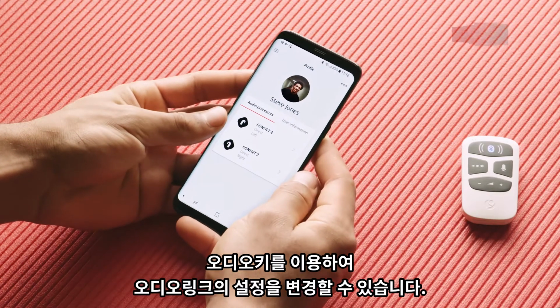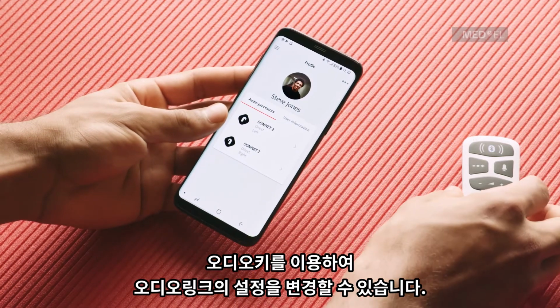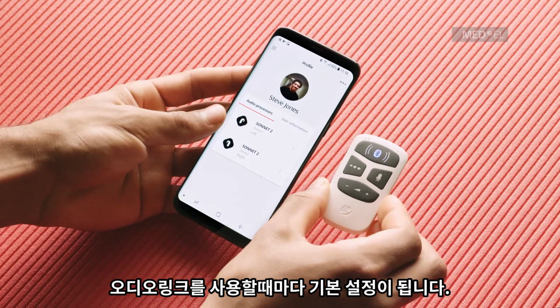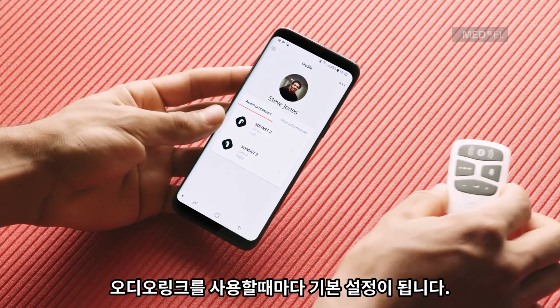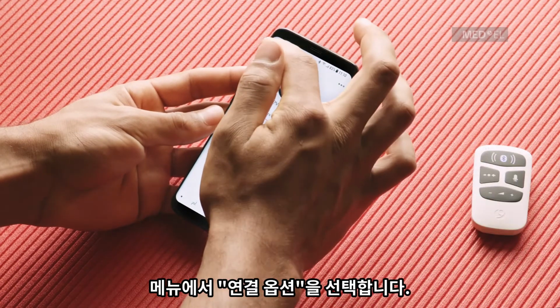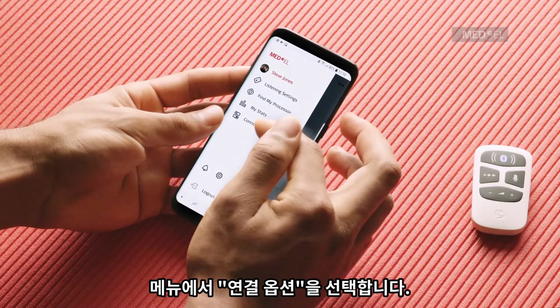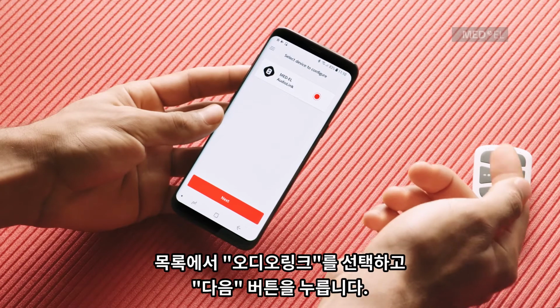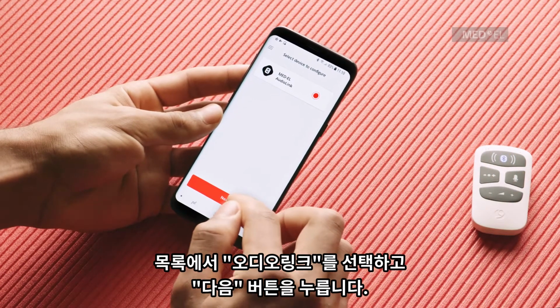You can use AudioKey to configure the settings on your AudioLink. The settings you change here will become the default settings every time you use AudioLink. Select Connectivity options from the menu. Make sure AudioLink is paired with your phone. Select AudioLink from the list and tap Next.